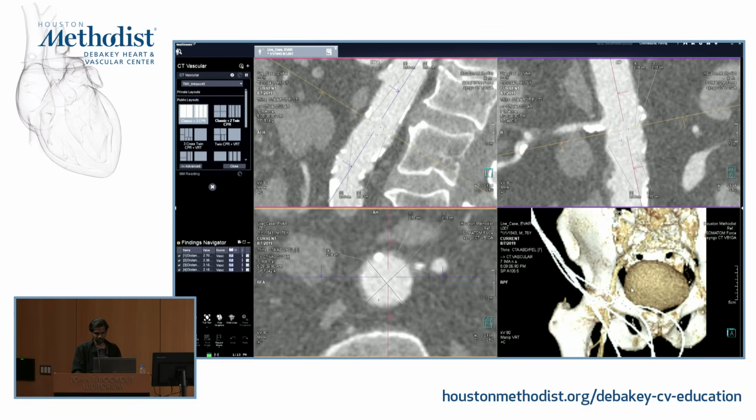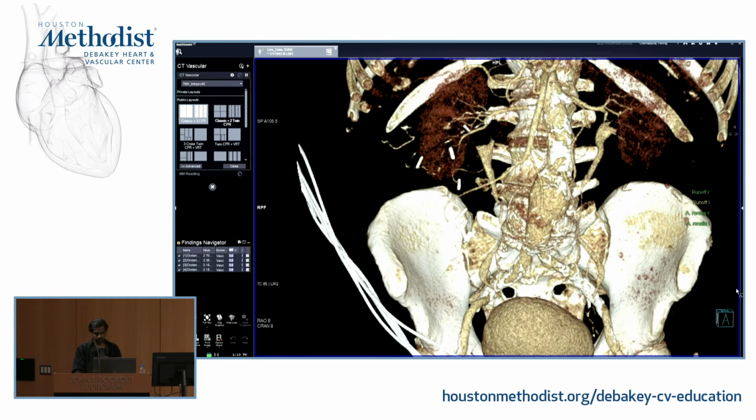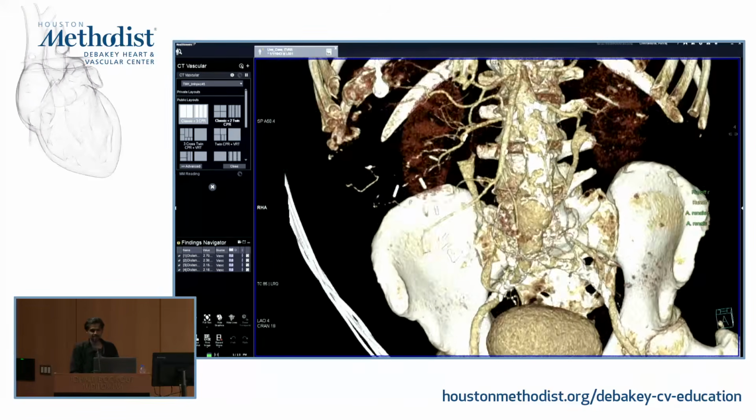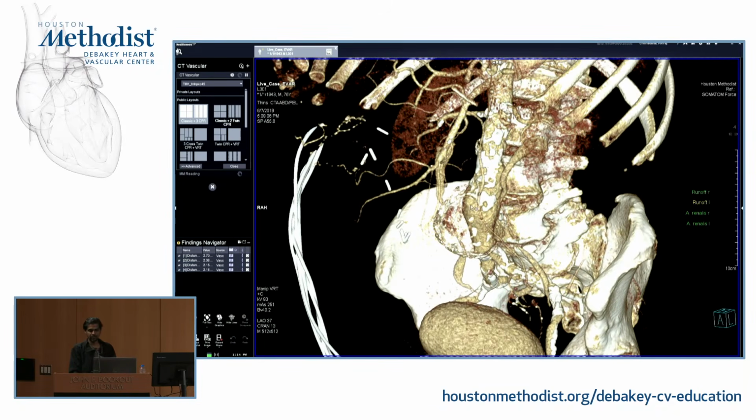Or you can go back to your 3D volume rendered views. So if I go back here, you see my center line, right? It's clearly within the aorta. If it was a dissection or anything, or if you don't have high resolution data, it can bleed into nearby vessels, or sometimes it can bow into the aneurysm and things like that.